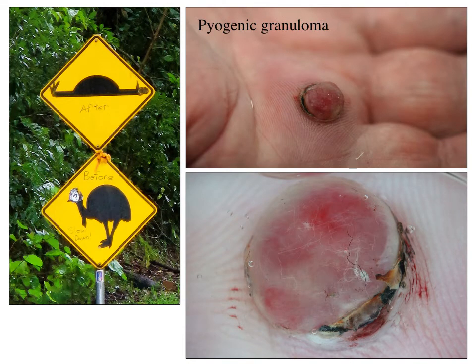It is impossible to make the differential diagnosis between pyogenic granuloma and malignant tumors on the basis of dermoscopy. This is why histopathological examination of every identified pyogenic granuloma is necessary.